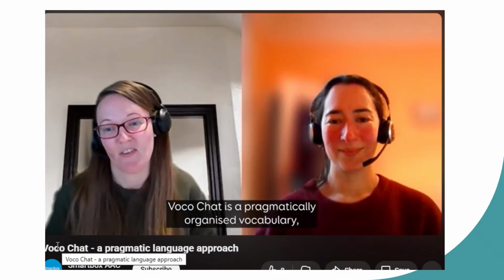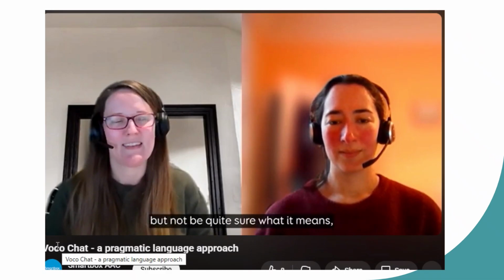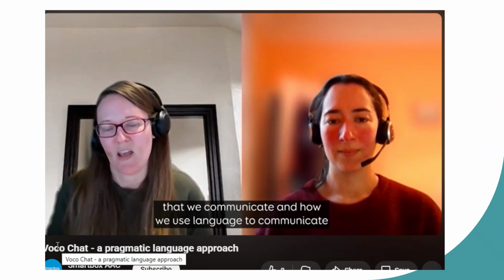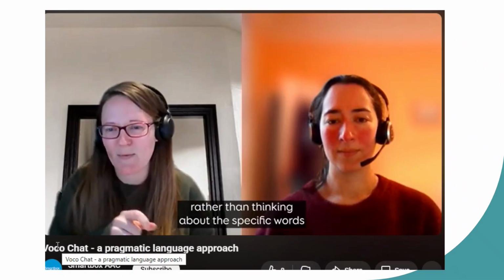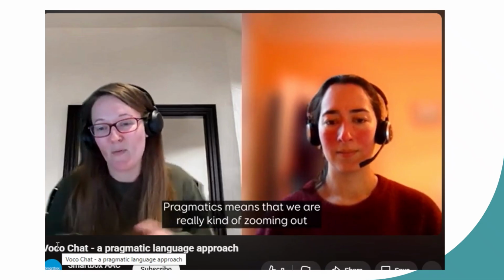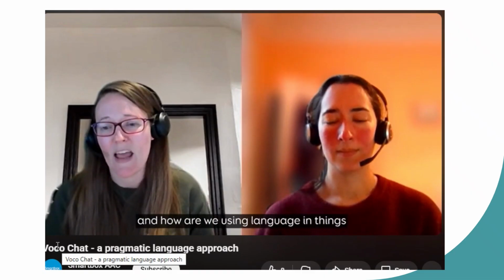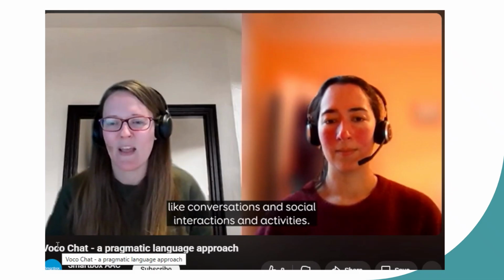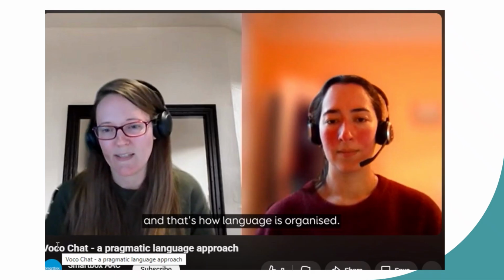VocoChat is a pragmatically organised vocabulary, and you may have heard of the term pragmatics but not be quite sure what it means. And all it really means is that it's focusing on the reasons that we communicate and how we use language to communicate, rather than thinking about the specific words that we're saying and how we're building up a sentence and thinking about grammar. Pragmatics means that we're really zooming out and thinking more about why we are actually communicating, and how we are using language in things like conversations and social interactions and activities. So VocoChat focuses on pragmatics, and that's how language is organised.